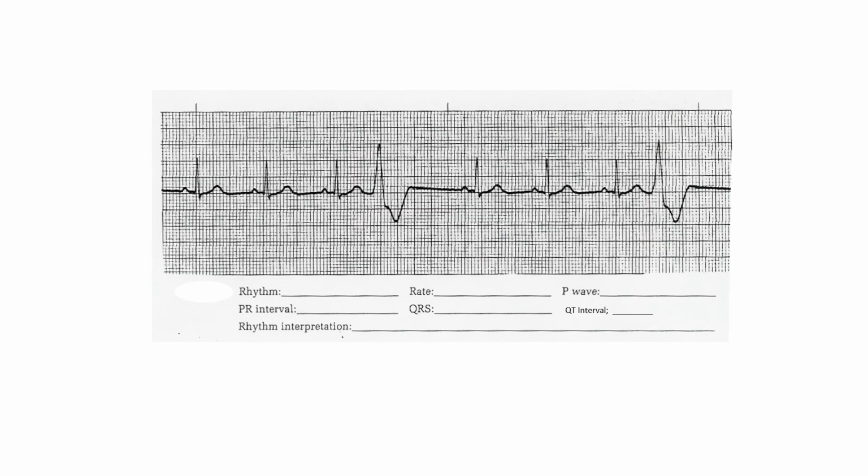And this one, this patient's basic rhythm is regular, and then it has PVCs, but the underlying rhythm is at a rate of 72. You do have P waves for your sinus beats, but you do not have P waves for your PVCs. Your PR interval, you're measuring before the QRS, and that looks like it's about 3 boxes or so.